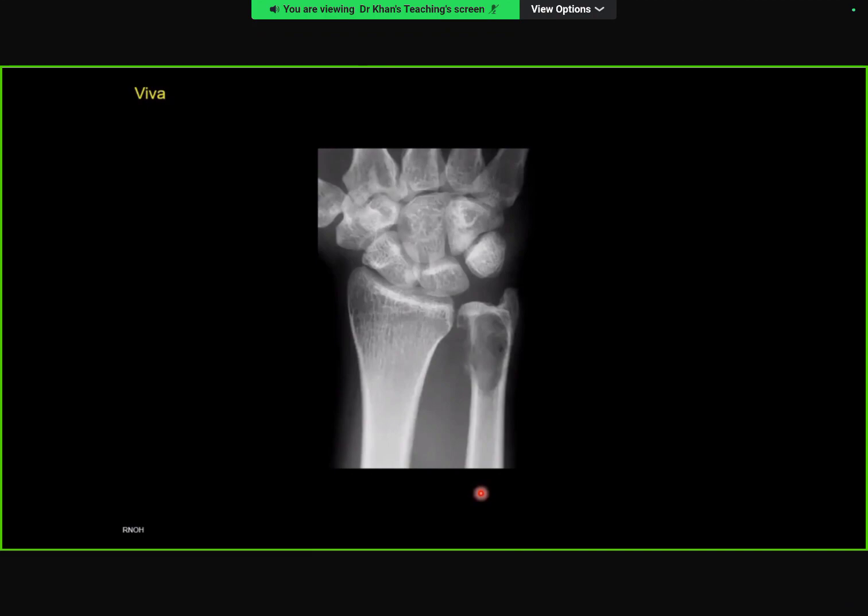Yeah, I think those are the most pertinent findings. Just looking at the rest of the radiograph, I can't see any other similar appearing lesions. So in summary, there is a lucent lesion in the distal ulna with overall, I would say, aggressive features, although there is a narrow zone of transition. In a patient of this age, my primary differential would include a giant cell tumor.